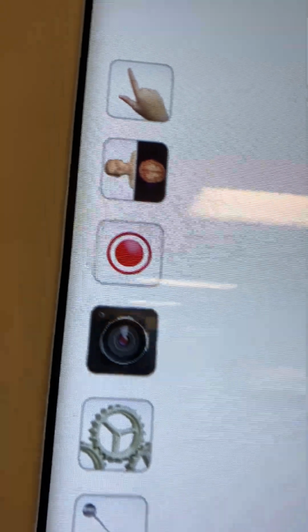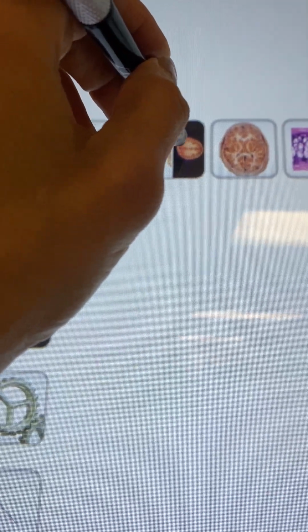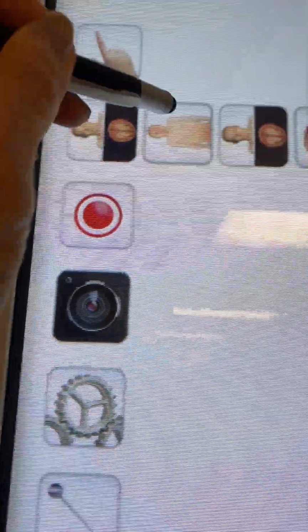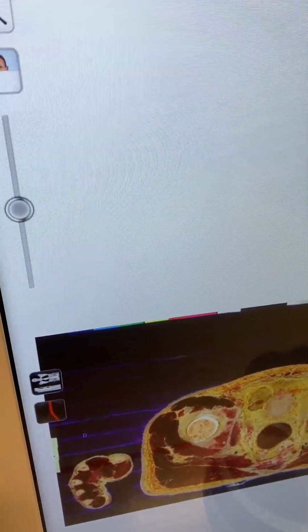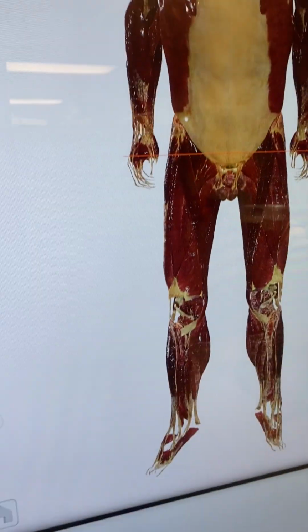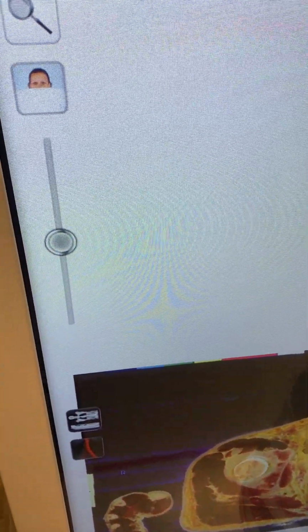Let's look at the icon for 2D. Let's tap on it for the 2D, see what comes up here. Tapping on the 2D layout, that was not just 2D, it is 2D and 3D together. You can see the icon shows this. On the top you can see the 3D, and at the bottom you can see the 2D. They are coming together. If your tablet is in a horizontal mode, on the left side you will have the 3D, on the right side you will have the 2D.